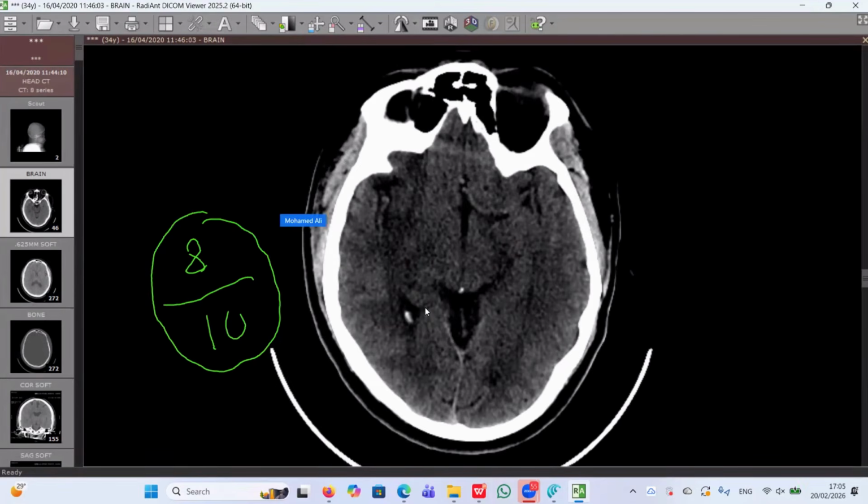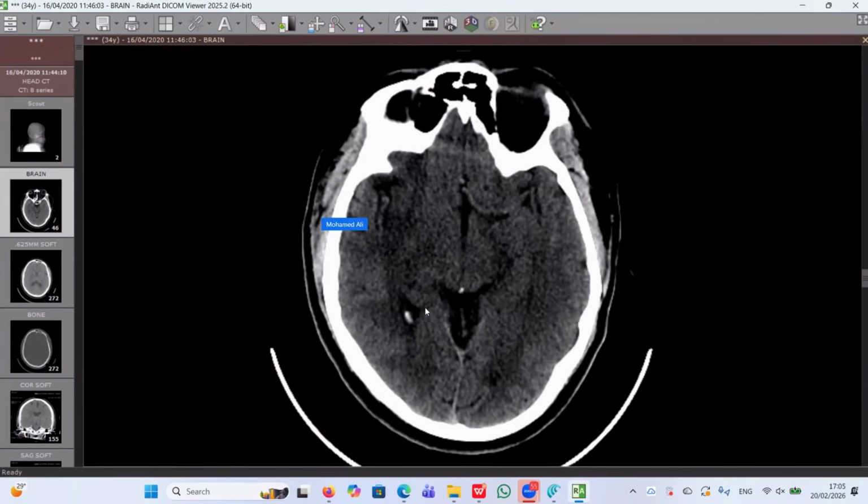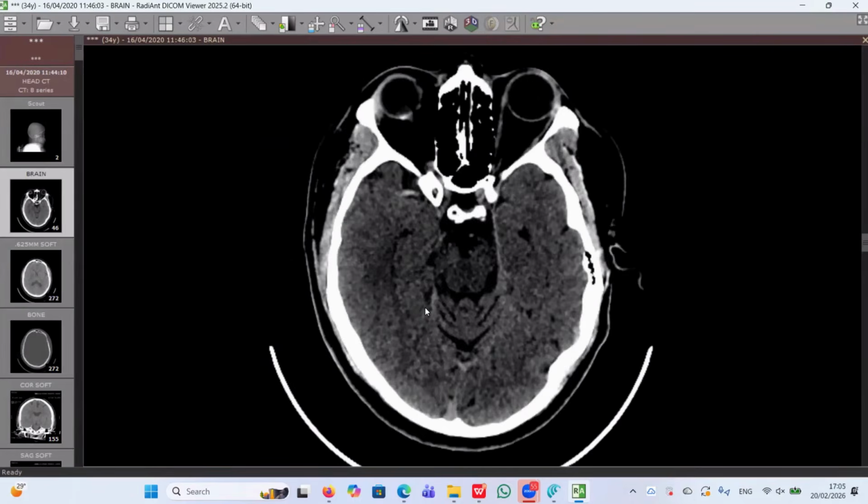So we are counting the normal brain tissue. If we have ASPECTS of 6 or lower, this is a bad prognosis. If it is higher than 6, 7 to 10, we have a good prognosis. Also, one of the factors that determines the prognosis of middle cerebral artery infarction is the length of the dense sign, which reflects the intraluminal thrombus.